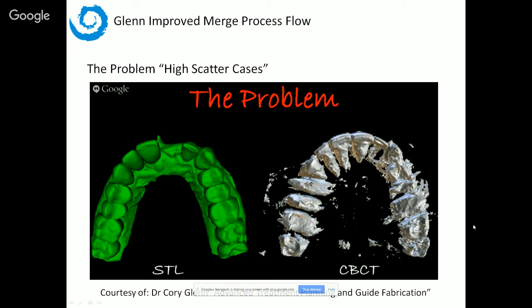We're not going to go into the edentulous cases at this point, but we're going to go through the process of dealing with this type of situation when you're dealing with a high scatter case. Now, the problem, if you look at the screen in front of you, it makes it very clear. The STL scan is a clear scan.